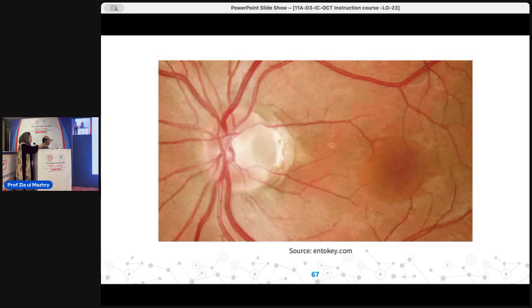जी यहाँ पे ये बिल्कुल, और इसके अलावा अब मैं अगर हूँ ना, मैं कहूँगा कि this is a fundus photograph showing the image of the posterior pole and centering on the optic disc and macula. And the optic disc is generally pink, but there is some pale and kind of alteration in the color and contour going on temporal part of the disc, and there appears a peripapillary atrophy as well, and the retina appears edematous. I would like to further investigate this patient.